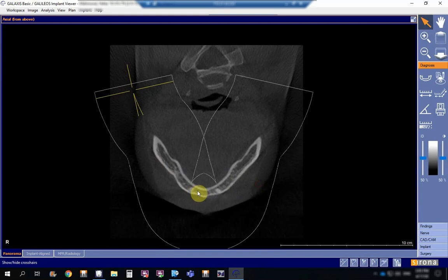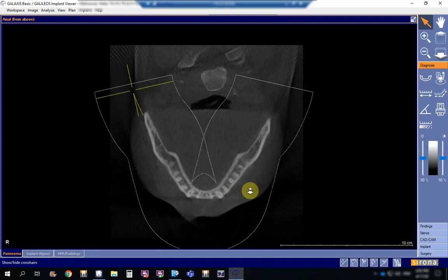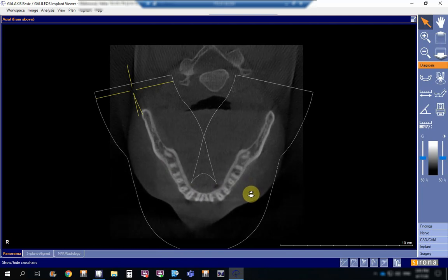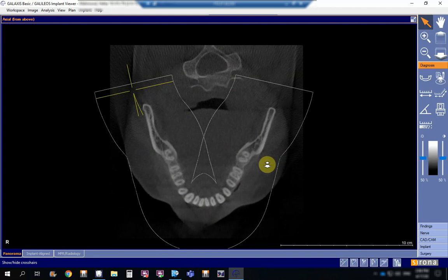And we started to see here the apex of the canines, lower canines being the longest teeth, and I will go up. I'm starting to go up now. Apices of teeth started to show. Okay, I'm going up, and now we're starting to see the teeth. See, now here I cannot differentiate between the cheek, the lip, and the tongue. All appear the same radio opacity. Atlas vertebra is very clear here, and the oropharynx is very clear. It always remains radiolucent. I'm going up now.